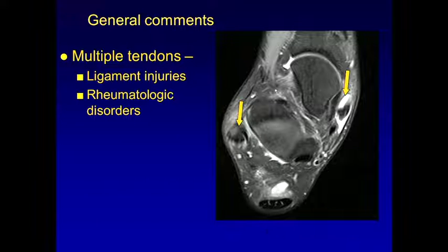This is a different patient. In this patient, this was a 24-year-old. We see peroneus brevis longitudinal tearing, maybe even peroneus longus tearing. We see posterior tibial tendon tearing. We see tenosynovitis. What's a 24-year-old doing with so much abnormality? This is a patient with rheumatoid arthritis.